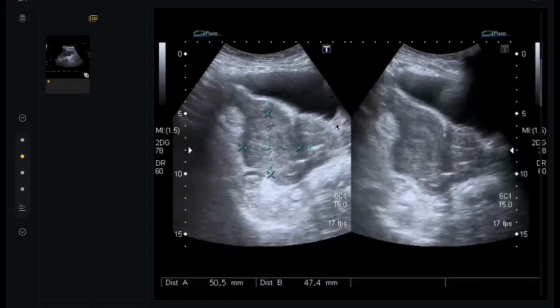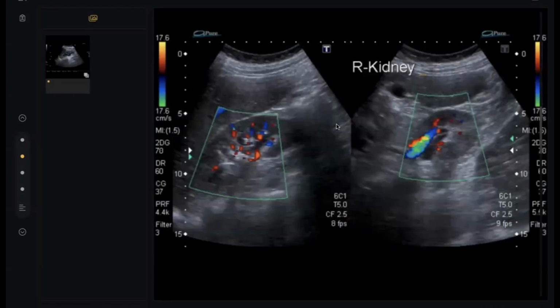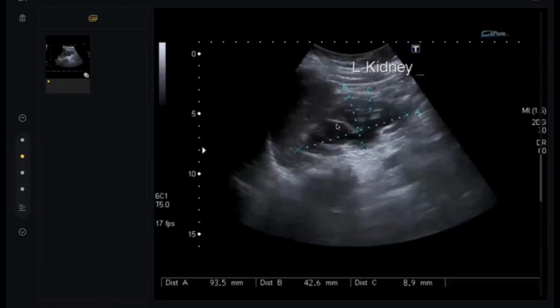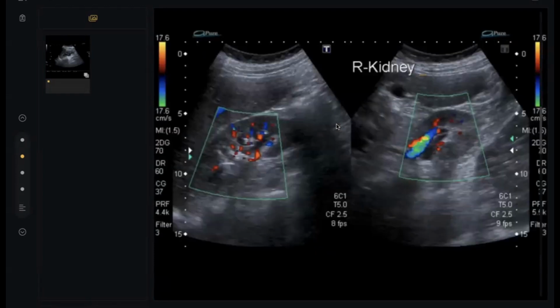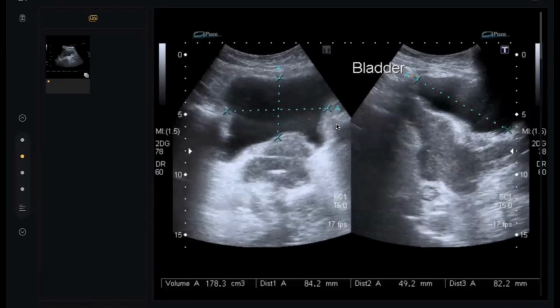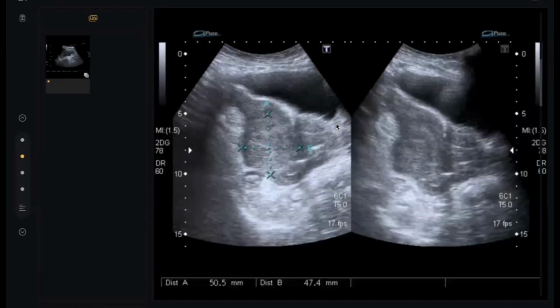So I'm presented with ultrasound of the abdomen and pelvis, just taking a moment to look through. I can see that there is some hydronephrosis of the left kidney, most likely due to this mass causing obstruction to the proximal ureter and therefore causing hydroureteronephrosis, which I would like to inform the urology team about, to possibly suggest a nephrostomy.